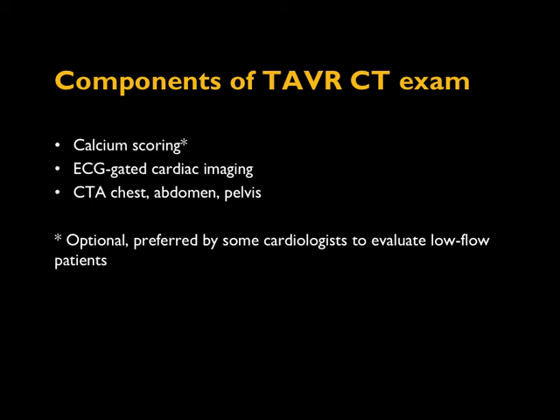piece of the exam. Some places do this routinely. I have some colleagues who always get a calcium score because they want to look at the degree of calcification of the aortic valve. In some cases, they may be on the fence as to whether or not they think this patient's valve disease is severe enough to warrant replacement.